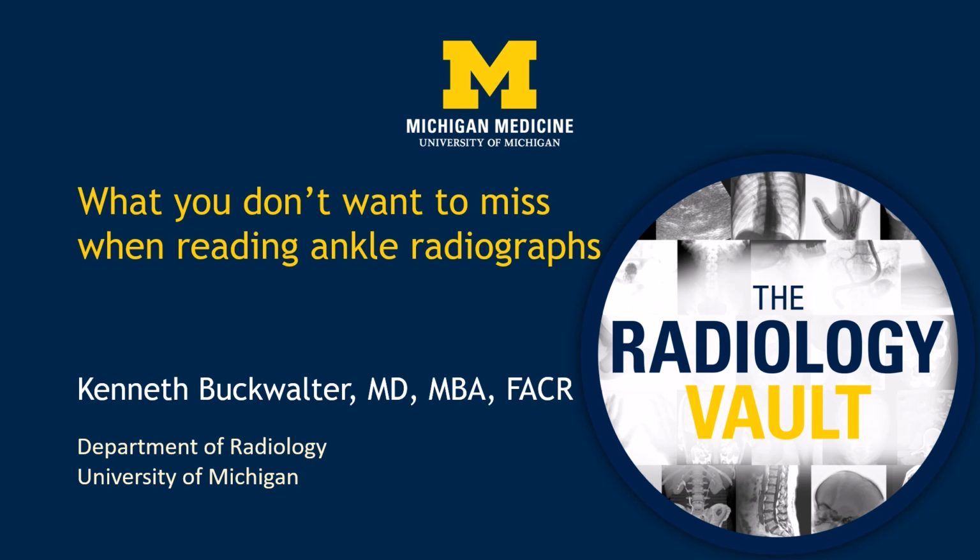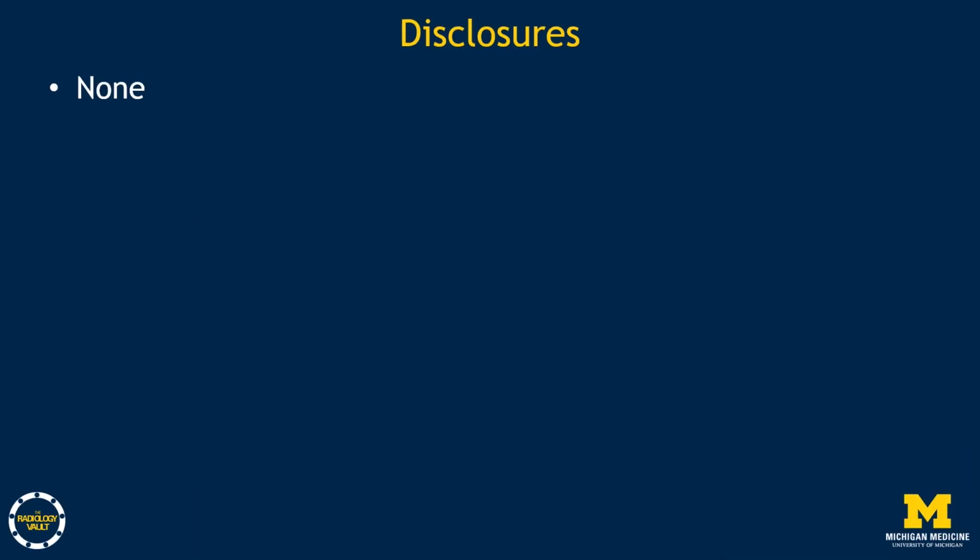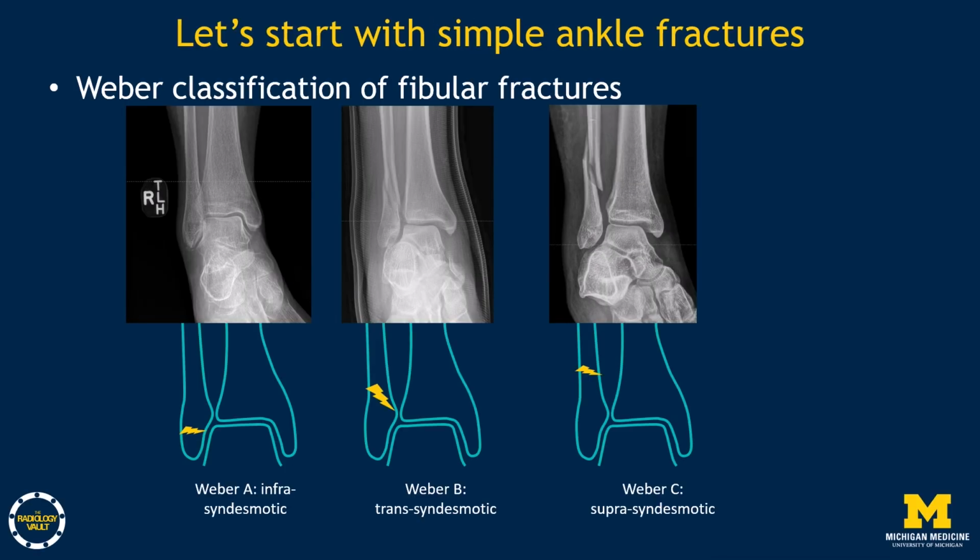Hi, this is Ken Buckwalter from the University of Michigan, talking about what you don't want to miss when reading ankle radiographs. I have nothing to disclose. Let's begin with simple fibular fractures.